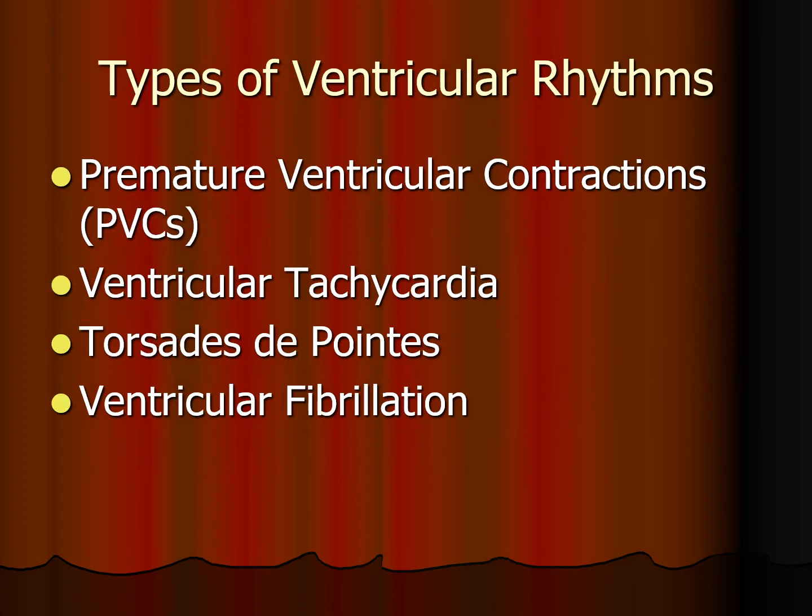Okay? So we have a premature ventricular contraction. Now, these are pretty normal, right? Most of us sitting here have multiple ones per minute. It's not a big deal. Ventricular tachycardia, uh-oh. Torsades de pointes, uh-oh. And ventricular fibrillation, code blue, right?